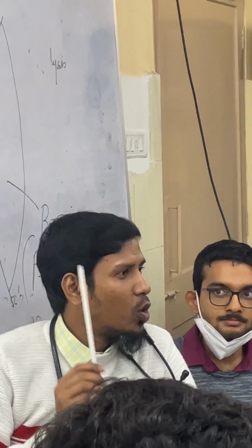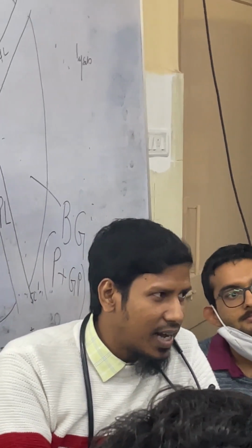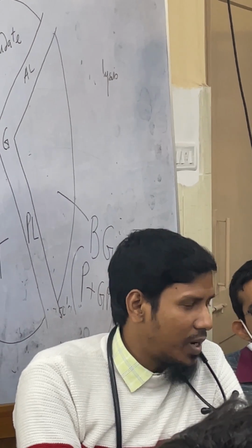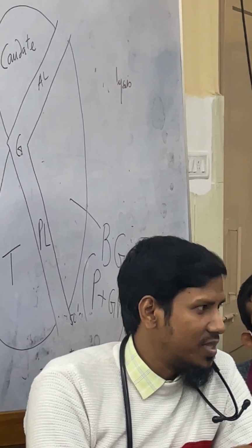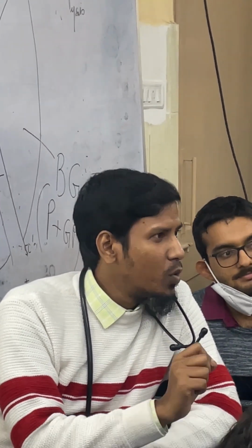Airway, we will go for the airway. If the airway, that means the trachea, is shifted, then the interpretation is a pushing or pulling lesion. So a pushing lesion, pleural effusion.